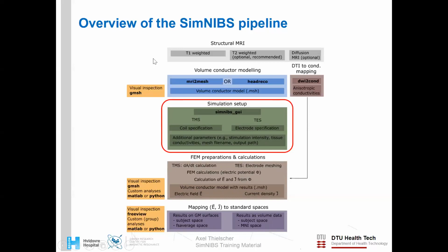When you don't have your own T1 or T2 weighted images, then we also provide a few example head models so that you can get started easily.